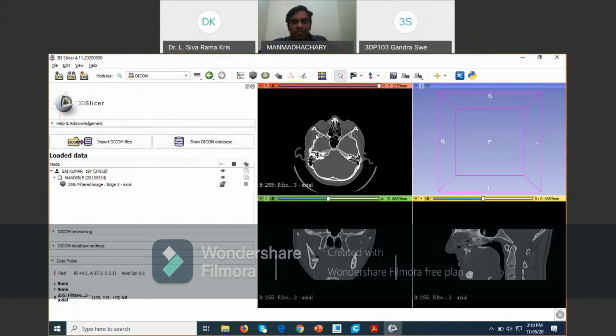Here also you are having the three views. As per our mechanical terminology, this is the top view, the side view, this is the front view. The doctors tell these are the axial, coronal and sagittal views. Sagittal, yes, sir, sagittal views. Can you show? I think in others or in InVesalius, the bottom right corner becomes a 3D image. Nice, sir. Yeah, here also it is coming. Just I will fix.